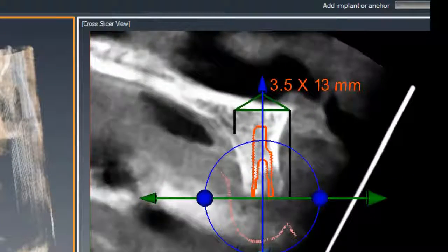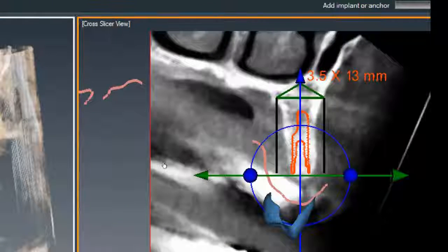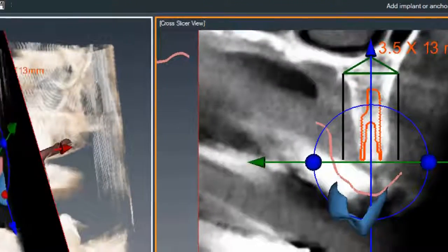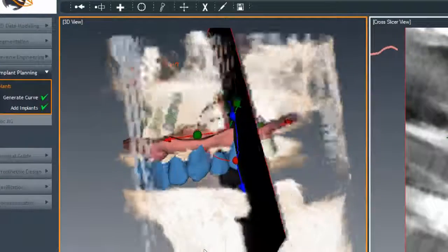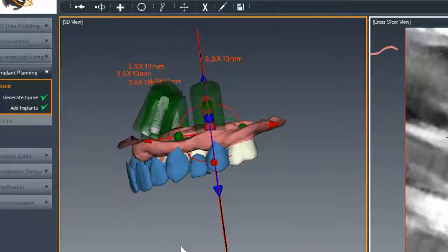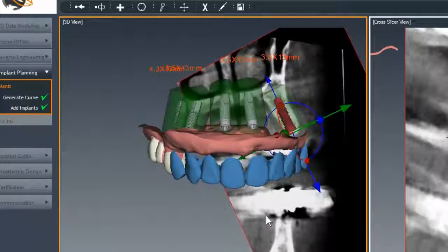Of course, the last implant, again, this shows it, and the last implant has to maximize the AP spread. It's going to be around tooth number 13 area, and it'll be a 3.5 by 13. Ideally, I'd like to put a 3.5 by 16 if you don't mind placing longer implants. I prefer to anchor them to the subnasal plate and get better anchorage.